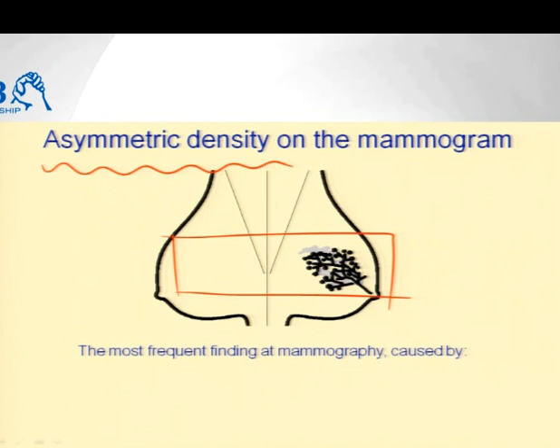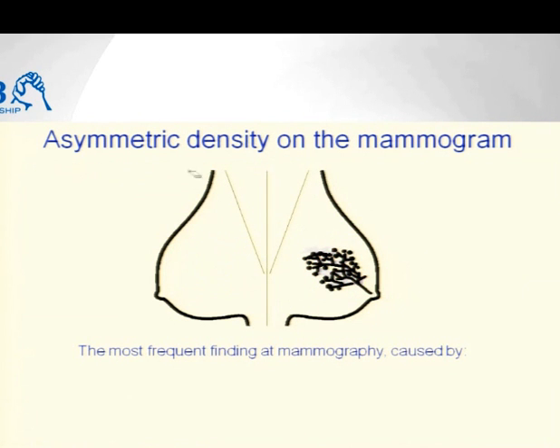There is a radiopaque density here, and on the corresponding area in the other breast, there is no such density. What am I going to do? Of course, the wrong approach is to always think about cancer. Cancer is a rare disease. Out of 1,000 screened women, only 5 or 7, less than 10, have it. So what are you going to do when the 995 come by?